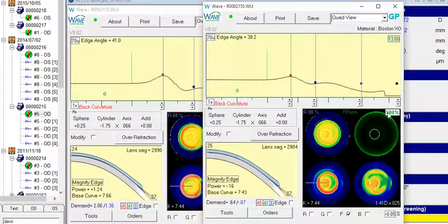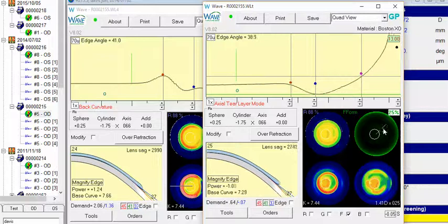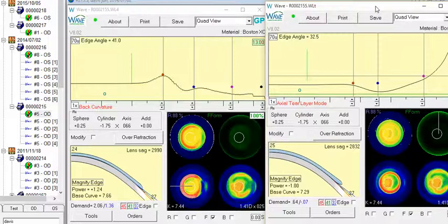You can certainly, if you want to stay in that meridian, click up on these a few times here, down in the red, a little bit more to soften up that meridian a little bit. You can certainly work on that meridian by meridian to give you a little bit more control of that design. But that was the original recommendation on that design.